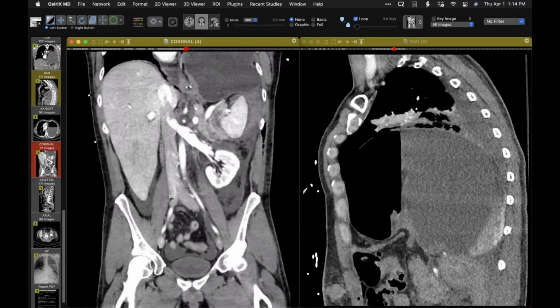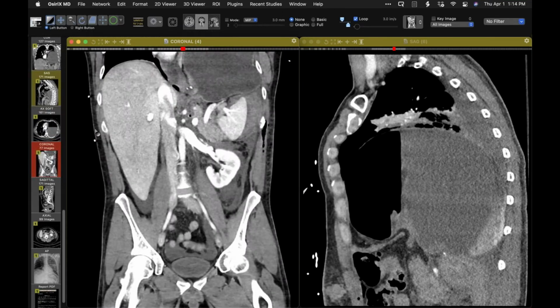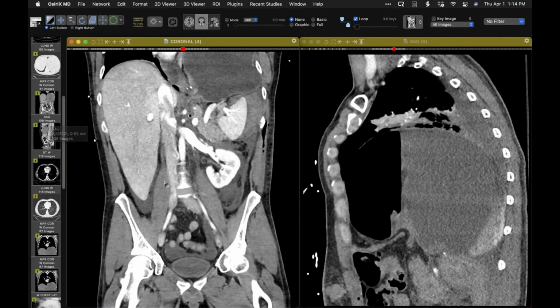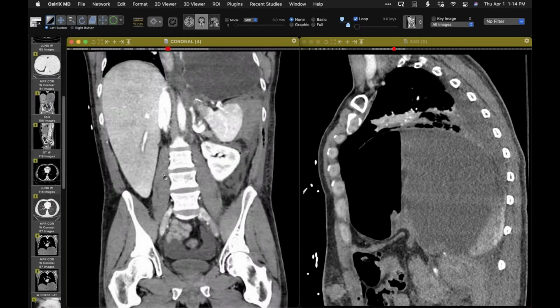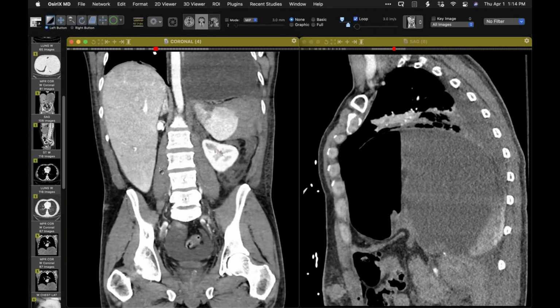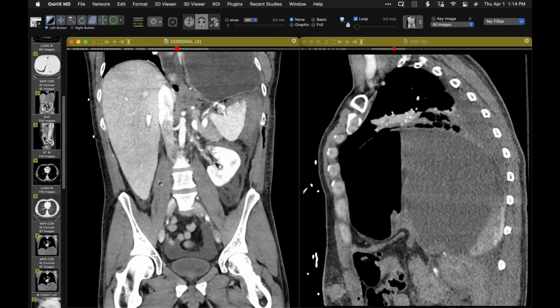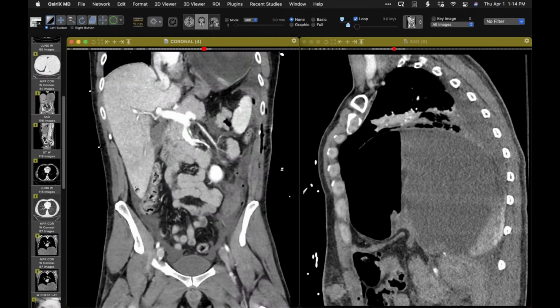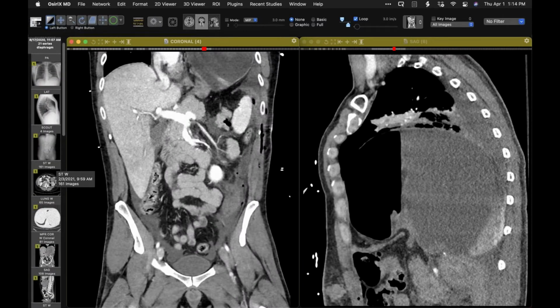Where was the initial tumor? I'm sorry. Was it abdominal or was it adrenal gland? It was a left adrenal. Okay. And you said it was a ganglioneuroma? Yeah, apparently it was a ganglioneuroma. It's fascinating. I saw a left adrenal ganglioneuroma last week. Oh. And I'd never seen one before. That's pretty random. Oh, yeah.